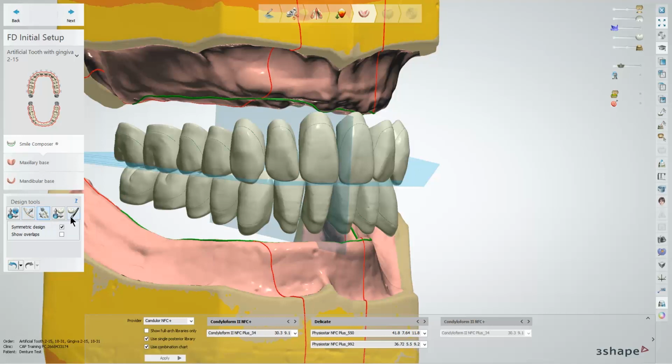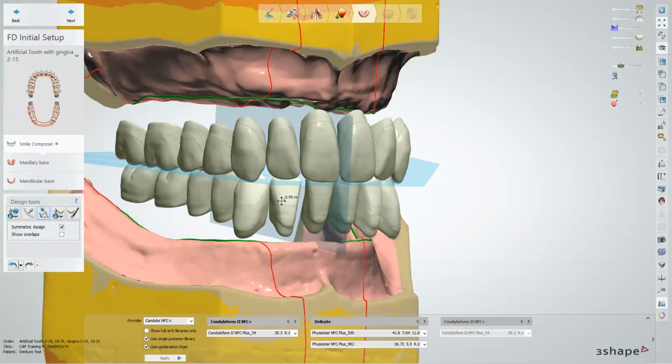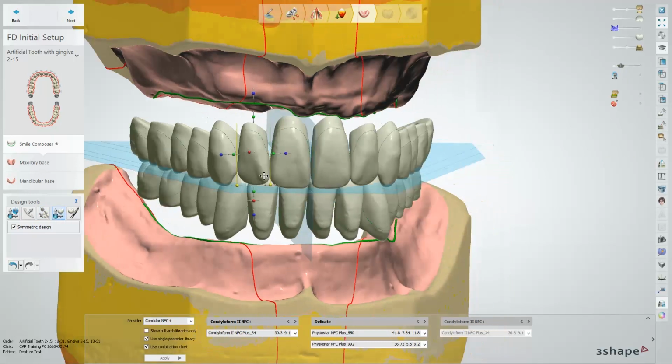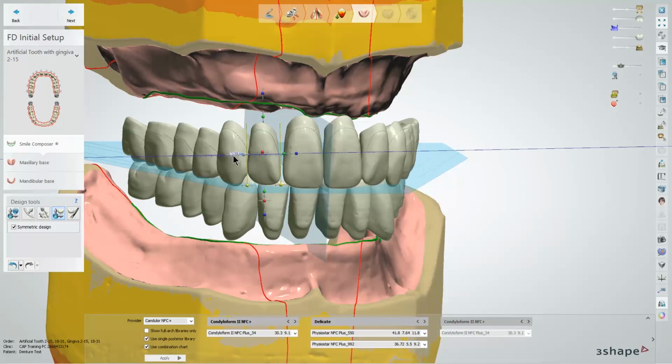Manual arrangement mostly keeps things at the same arrangement to each other, but starts to grab different groups of teeth depending on which unit you're selecting. But for most changes, I find it's best to use the individual setup tool. This one works fairly straightforward for all of its movements. Blue to move in a certain direction, red to rotate as needed.